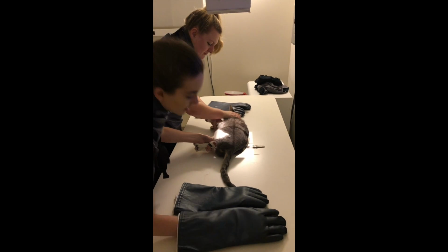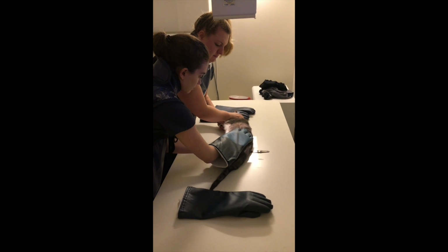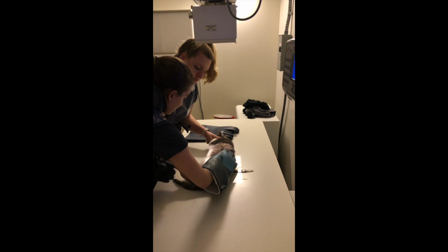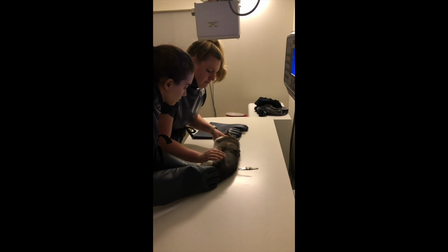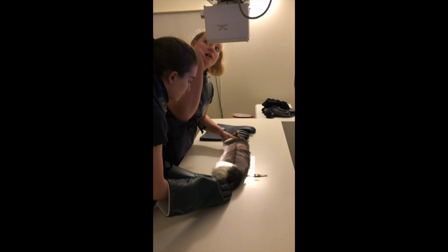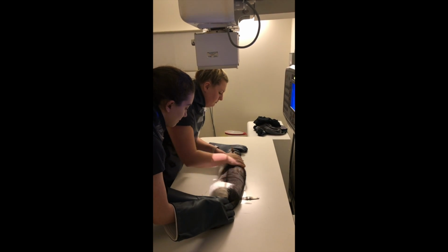The time intervals for cats are immediately post, 5 to 10 minutes post, 15 to 20 minutes post, 30 to 60 minutes post, 1 hour post, 3 hours post. These intervals are different because the cat GI tract tends to empty faster because by 30 minutes to 1 hour post, the complete small intestine can be seen.